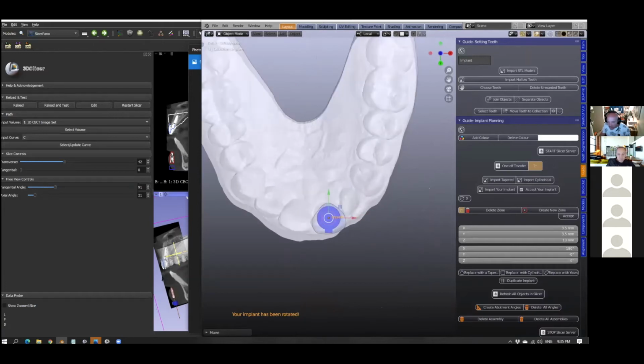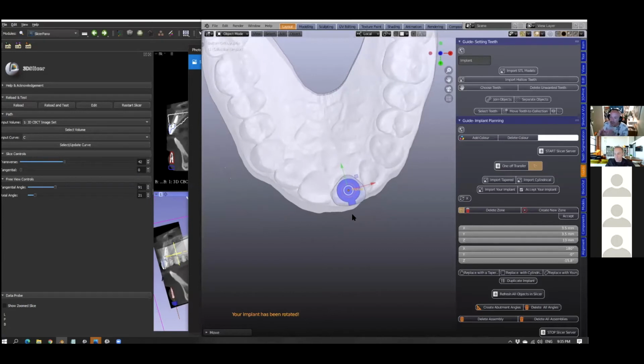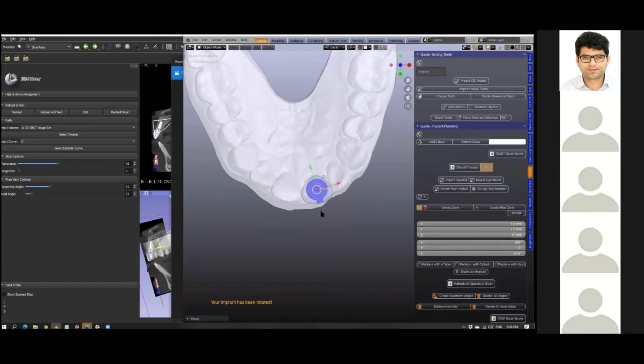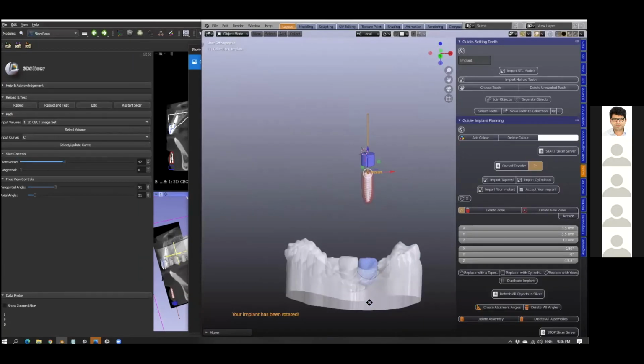Now you may wonder what this notch is on the buccal side, and that's so that if you've got an angled abutment, we can then calculate where the flat side or a landmark on the implant where the buccal side is, and the angle will then veer away from that specific side, so that we can predetermine how this angle is going to be. So I'm going to use GZ, sync it. So this is the initial placement.